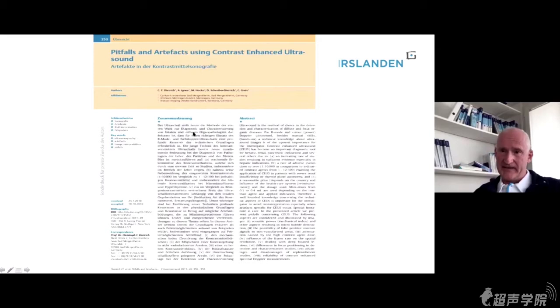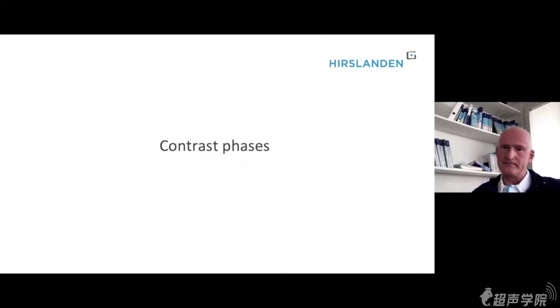All what I have been telling right now has been published in the paper shown here, pitfalls and artifacts using contrast enhanced ultrasound. Let's talk first about examination technique. Right now we have been discussing how to improve the image.